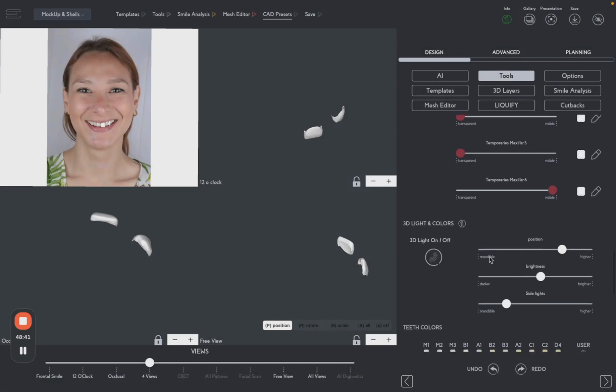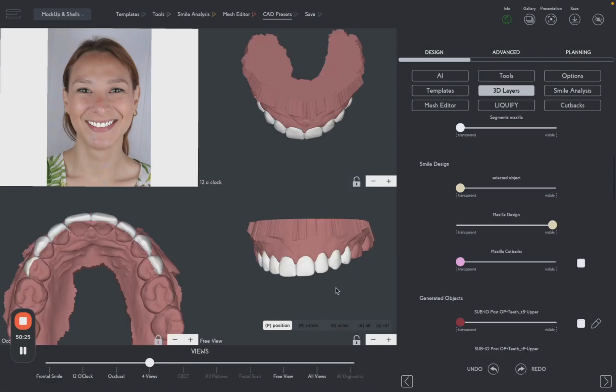And so I'll just cancel, and we will export all of these files from one place, from the case management, save the project, and then we'll have the option in the case management to export all the patient's files.